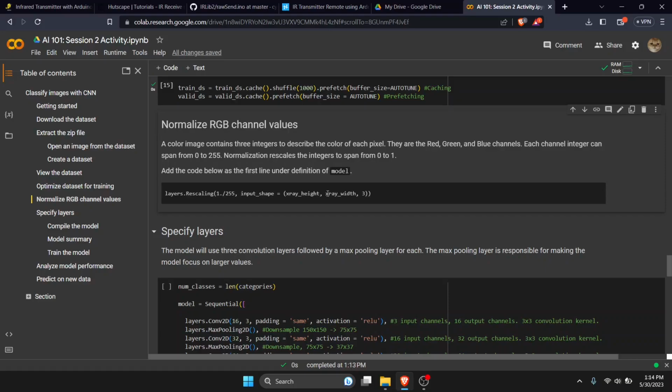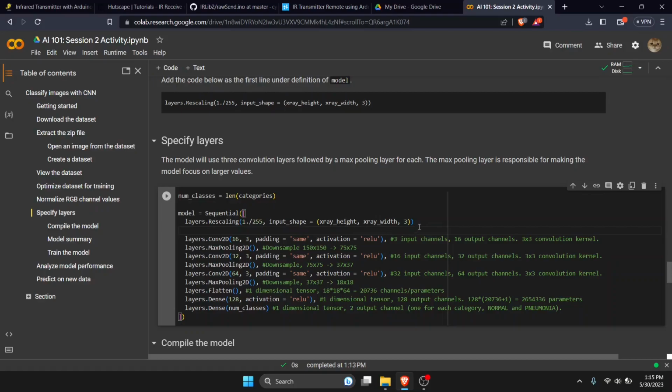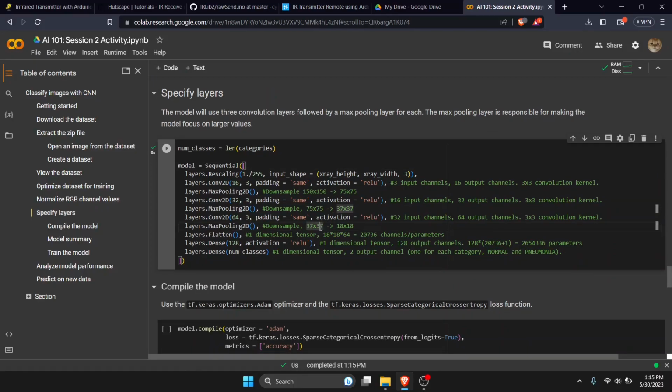And the more theoretical reason why we need to do this is because it actually converges faster if your values are smaller. So we're just going to copy this, all right? Copy that, Control C. And then we're going to go here, okay, Control V. And then at the end of this, you need to put a comma. This is important. So this is actually your definition of your entire network. These are all your layers.